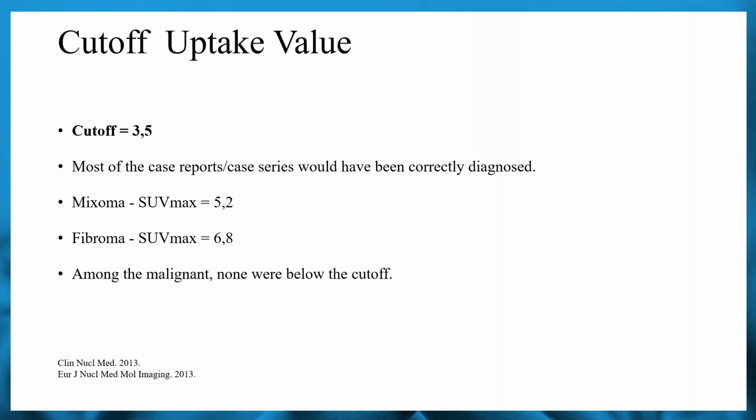And the other thing that maybe happened in this case is that sometimes it's difficult to differentiate if the site where you are looking is exactly the point of the tumor, because it's important that the physiological myocardial uptake is very low or none.